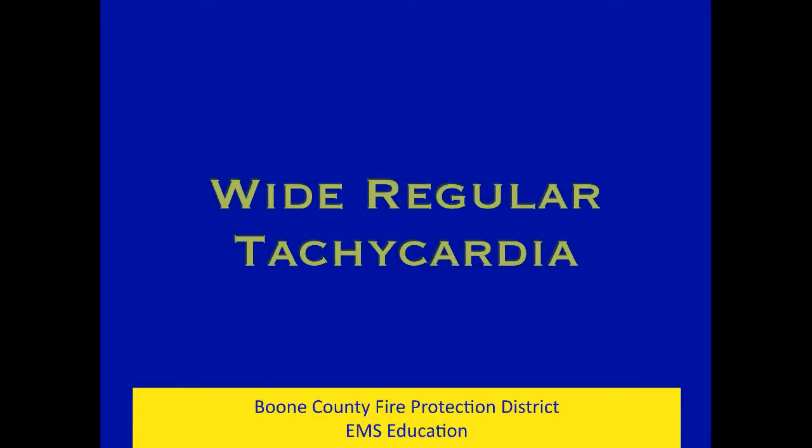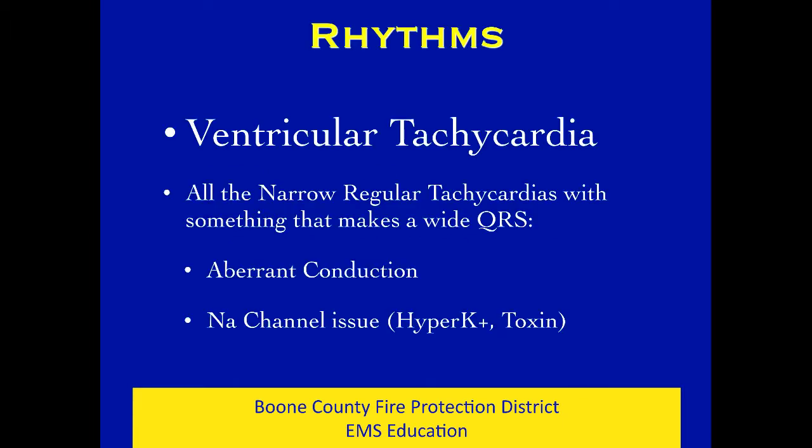All right, let's get into wide regular tachycardias now, another in our series of the tachycardia lessons. And so what rhythms could be wide and regular? So V-tach, V-tach, V-tach, V-tach, and then something that wants to look like V-tach.